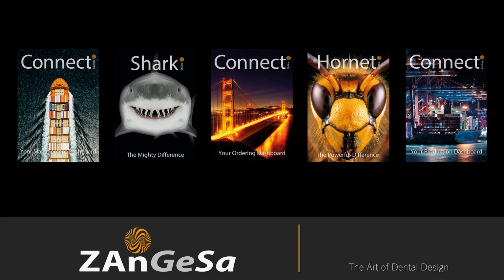Connect Factory supports your seamless production data flow. You can boost your high-quality production center for dentures with additional functionality.